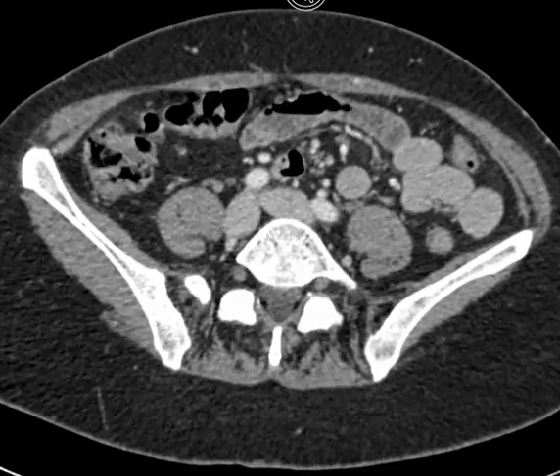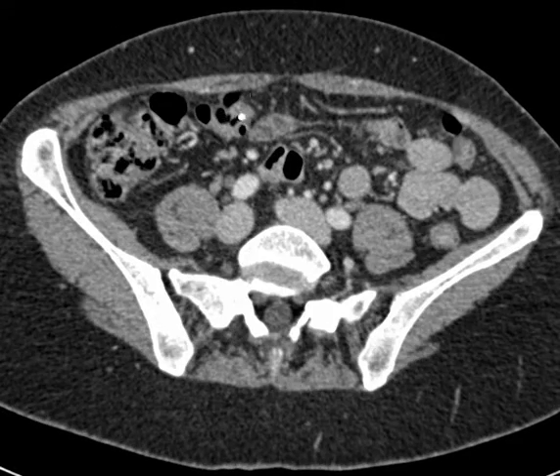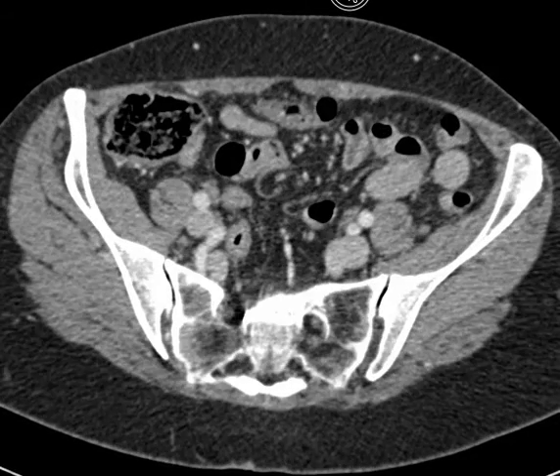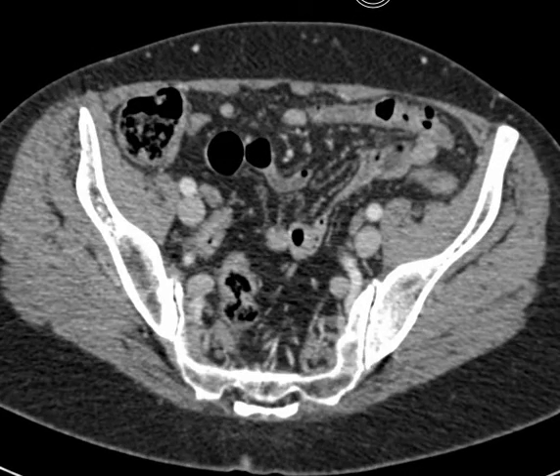Okay. So the transverse colon, again, is right here as we've continued to track along. And in some people, this can be quite long. It can head quite far inferiorly, and in some people it doesn't. But again, here's that transverse colon. Okay, and then as we continue on, now it's made its way all the way over to the left side of the patient. And then we're going to go from the ascending colon, transverse colon, now to descending colon.